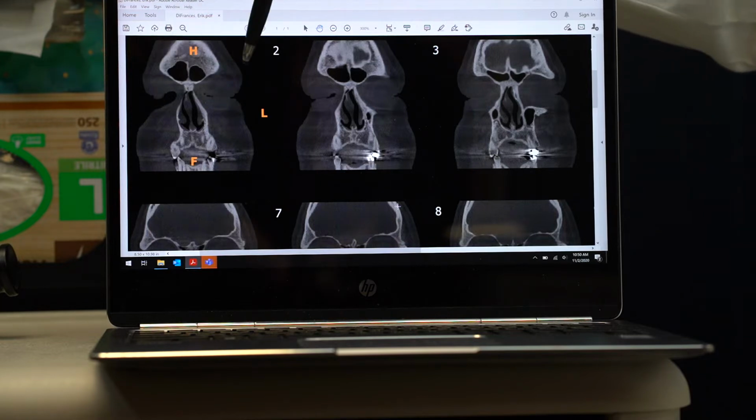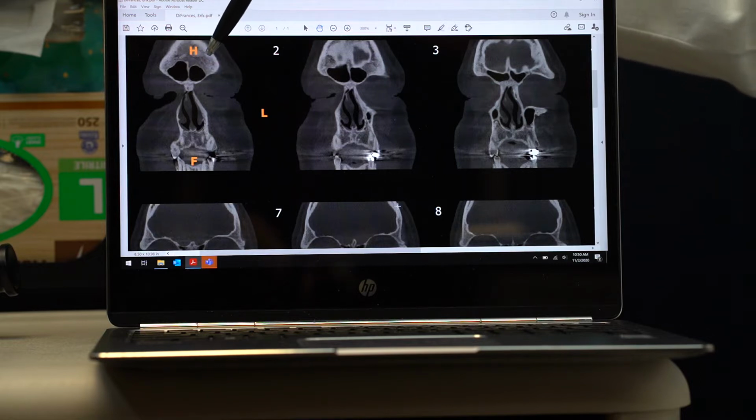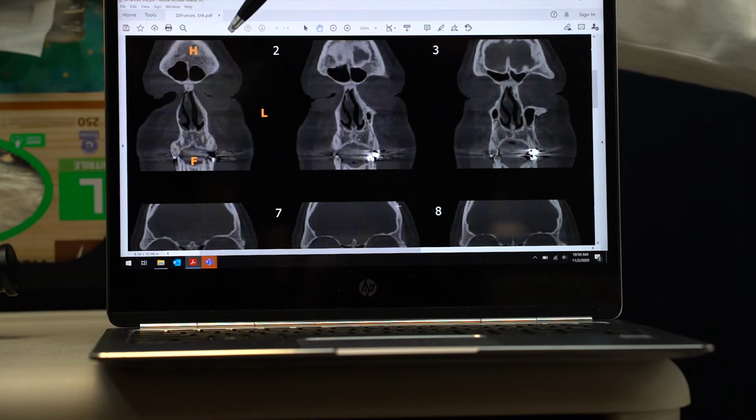In this cut here, we can see left eye, right cheek, left cheek. And then you see the white that I was talking about. There's white here, that's this patient's forehead, but then there are these black areas here and here. Black is air, so those areas are the sinuses in the forehead, and those sinuses on this CT scan are generally looking okay.